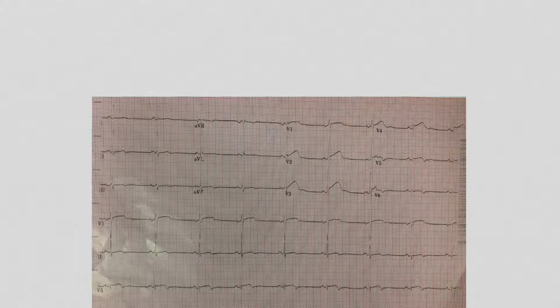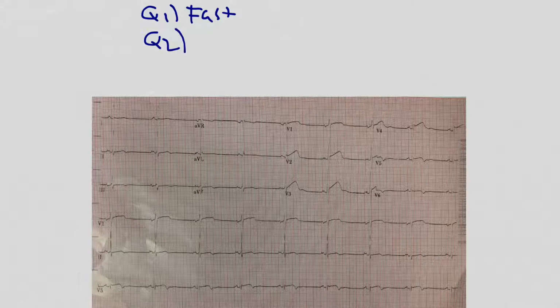Here's the second EKG that we'll look at. We're going to start the same way and ask our same first two questions, which is: is the rate too fast or is it too slow?